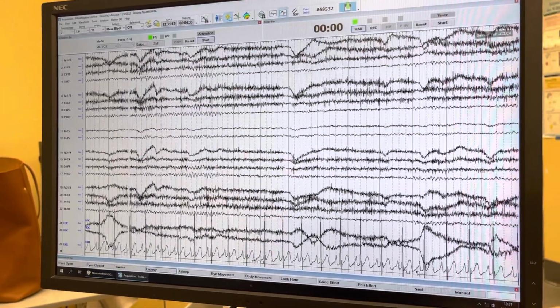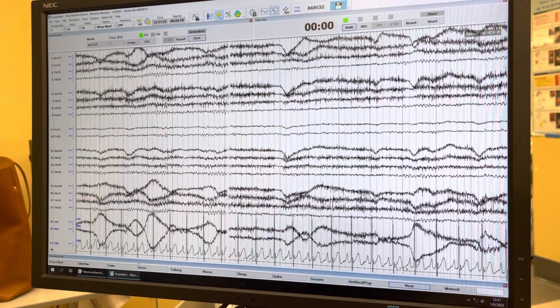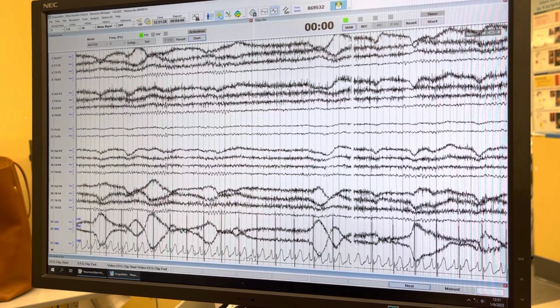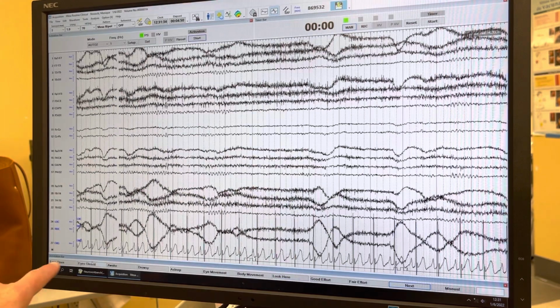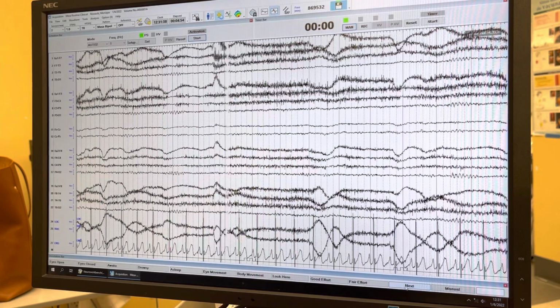So right here you can just hit next, and this will bring you up to give you a new line of annotates. And then if you hit next, it'll go back to the first one. So here you can see down here, you can see eyes open, eyes closed, a bunch of annotates, and here's the next button.